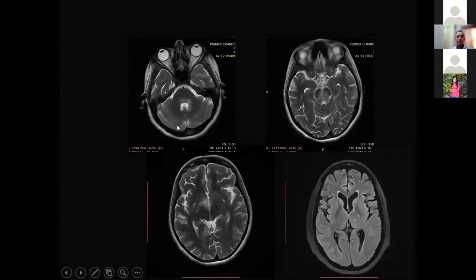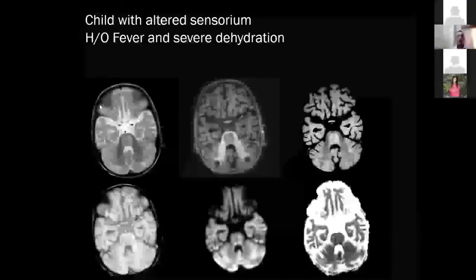Another patient with focal neurological deficits, there are lesions along the ependymal surfaces around the fourth ventricle, around the periaqueductal gray matter. The involvement of the optic chiasma may suggest a diagnosis of NMO or NMO spectrum disorders.